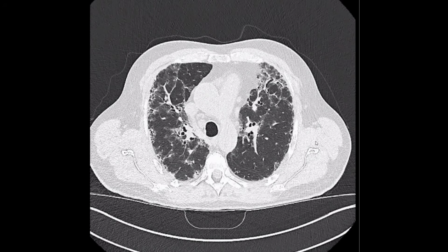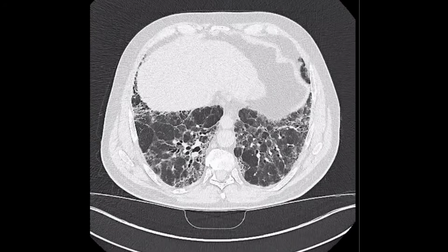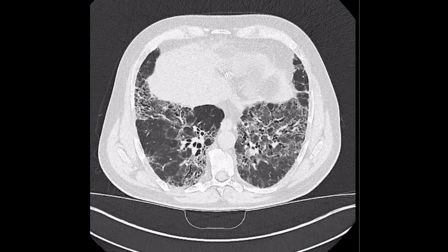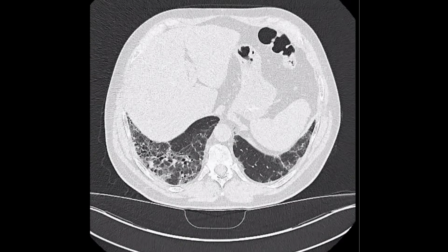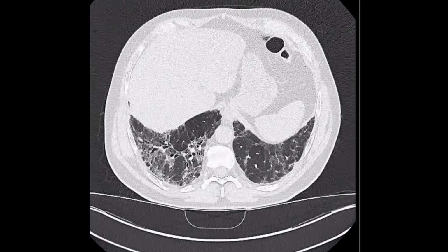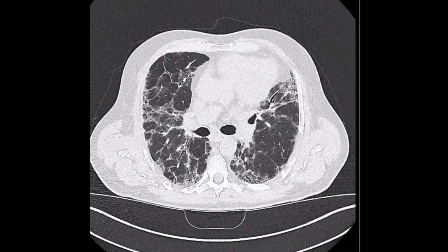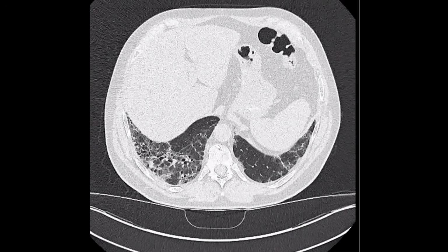As you said, we have coarse fibrotic reticulations, and the distribution is very important: the reticulations and fibrotic changes are hilar, central, and extend to the lung base. You are right, and we also have some ground glass, different densities of the lung, and mosaic attenuation, and we proved that this one is associated with air trapping.